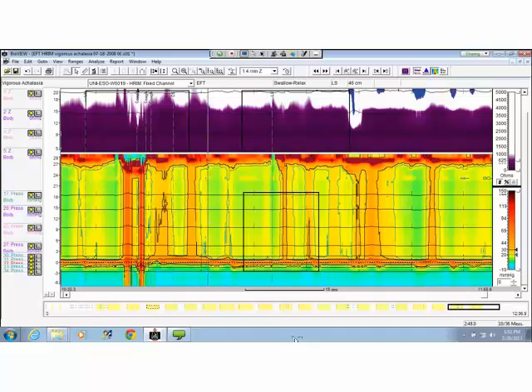Many times you'll see studies when they have disrupted motility where you'll have weak or no peristalsis at all, and then there's a delay and there's another peristaltic wave that shows up later. And just like the traditional, you follow the same rules. If you measure it traditionally, you would measure it with the Chicago. If you're not going to measure it traditionally, you wouldn't measure with the Chicago classification measurements.